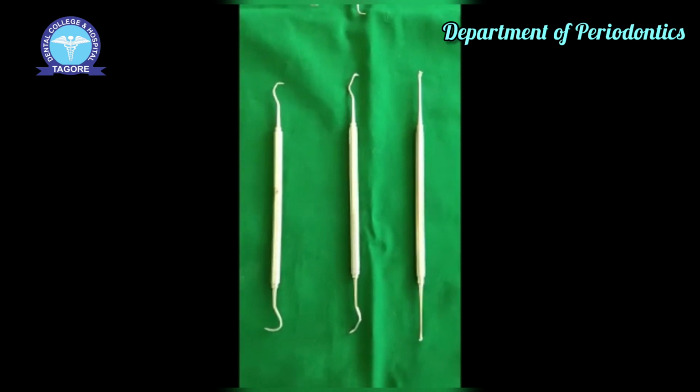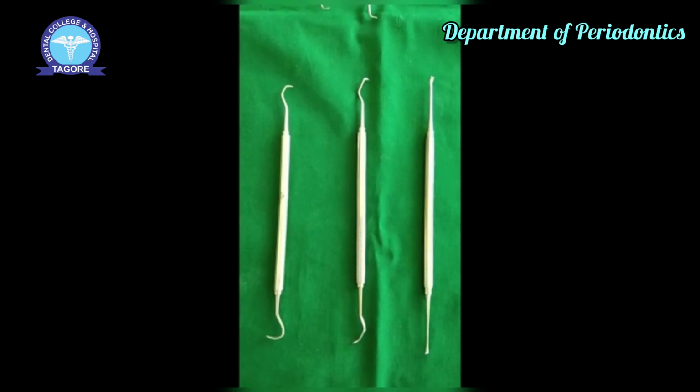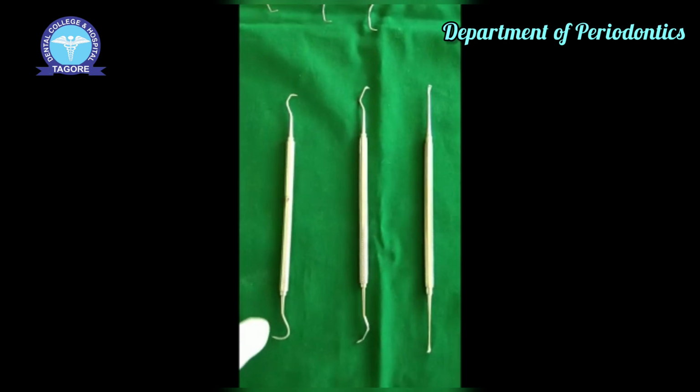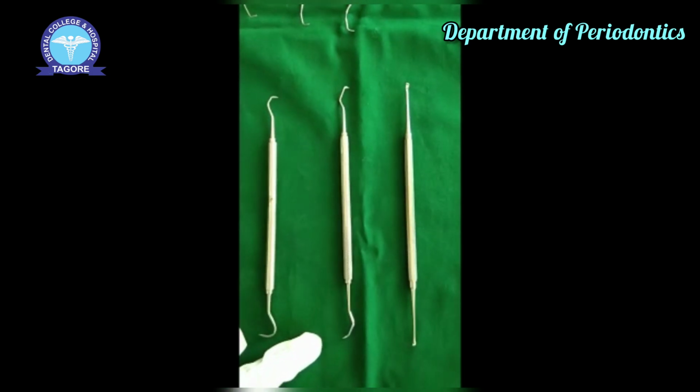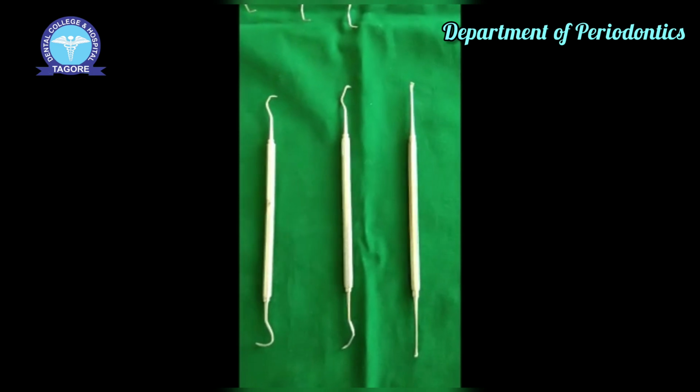Next we will see about scalers. Scalers are used for removing supragingival plaque and calculus. There are three sets of scalers: anterior scaler, universal scaler, right and left posterior scalers, and two surface scalers, which is a modification of the hoe.